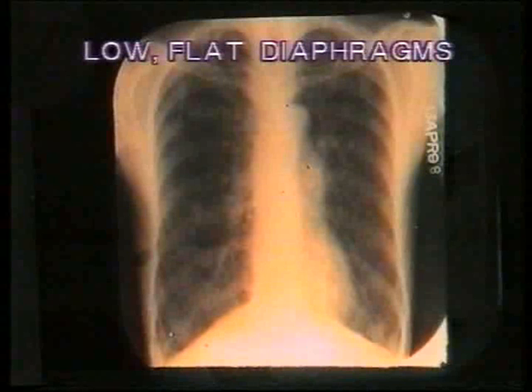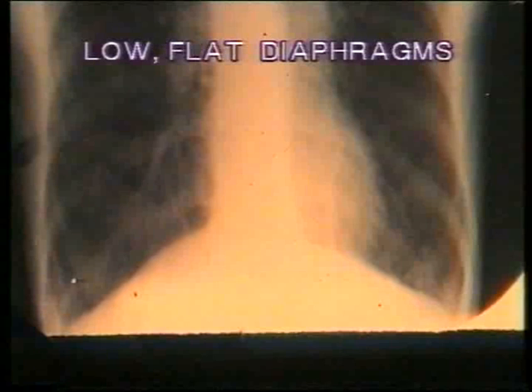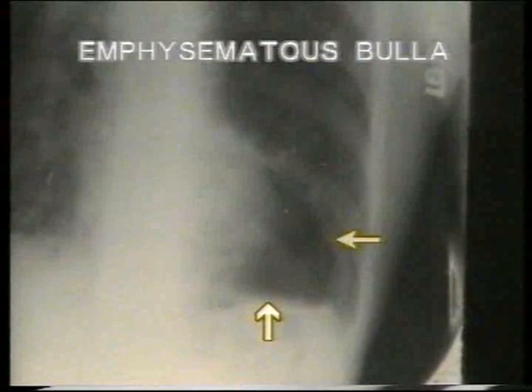This is another X-ray of emphysematous lungs, shown for the low flat diaphragms. Note that the curvature of the diaphragms is reduced and they are almost straight. If right heart failure, that is cor pulmonale, has set in, then the right ventricle will be enlarged.